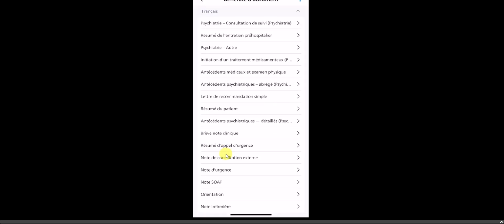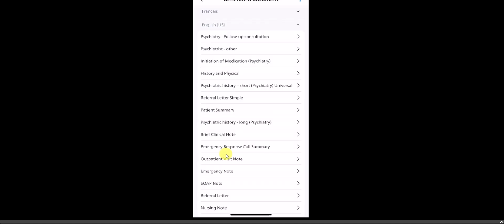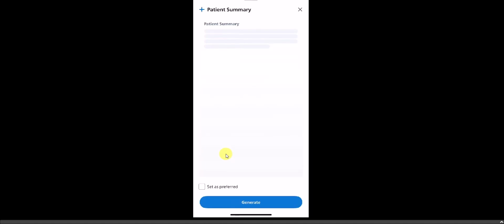So we've recorded this encounter here, and now it is going to create a transcript of it, and then give us the ability to get an AI summary as well. So we're just going to go ahead and submit this to the AI, and we can choose from a plethora of different summaries that we want it to be output as. So we'll try something like, let's do a patient summary, and we'll hit generate, and it will generate it for us here.